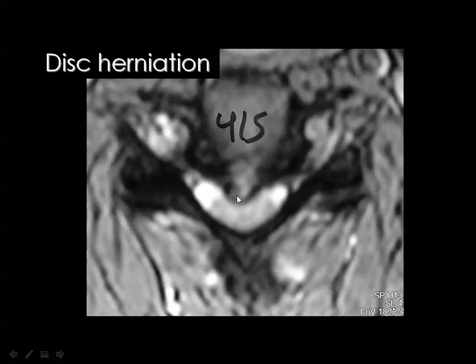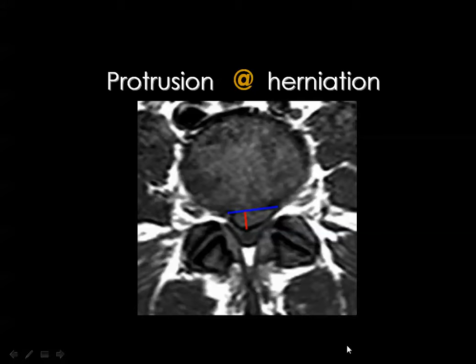Look at this example. You see here a central disc, and this disc by measurements is more than 2 millimeters, and you consider it disc herniation. Then, how can you differentiate between herniation and protrusion? You can measure. And there is a third way.